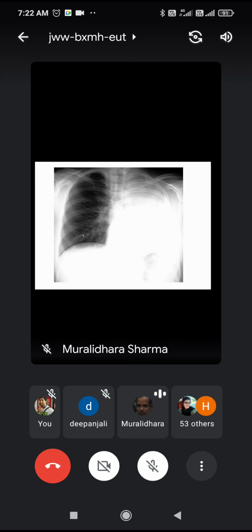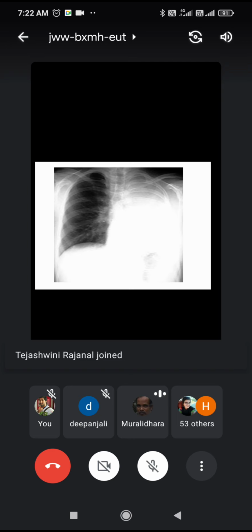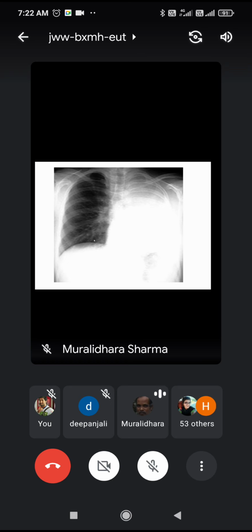In addition to this, there is another feature on the right lower lobe. You can see these fibrous bands. Multiple fibrous bands are seen, and the lung tissue seems to be expanding even more over the diaphragm. Now, this is typical of emphysema. We will have more discussion about the emphysema in the next classes.